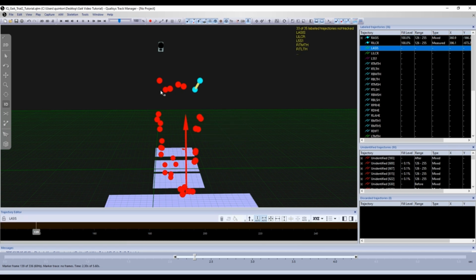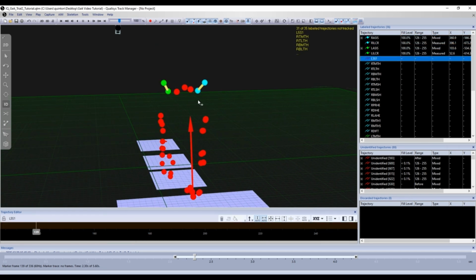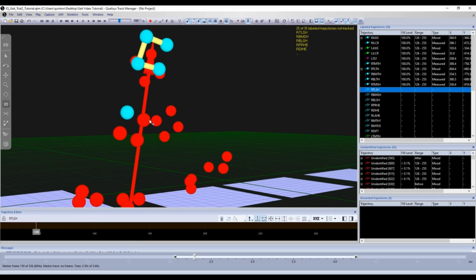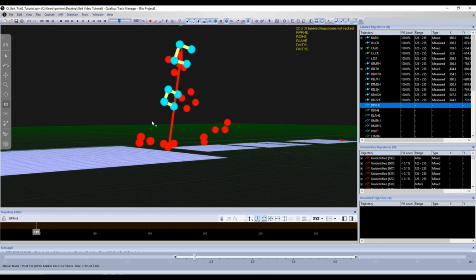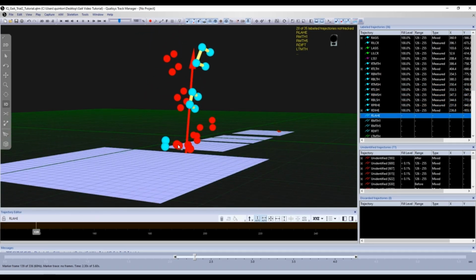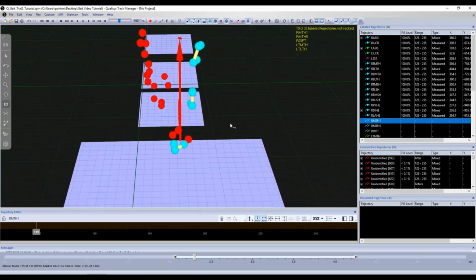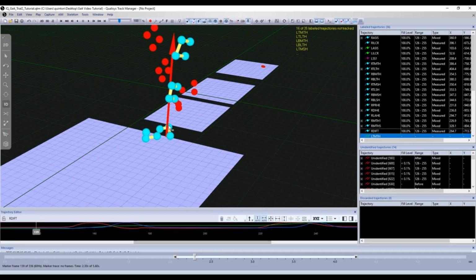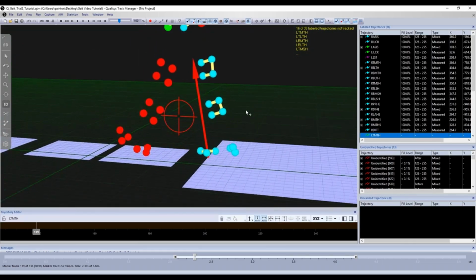Over time, as you continue labeling, you'll become more efficient, not only at labeling markers, but also at understanding proper marker placement and anatomical landmarks. We'll also cover different filling situations so you can continue to improve your overall efficiency and accuracy. I recommend that you pause whenever you feel like you need to, or continue as you feel comfortable.